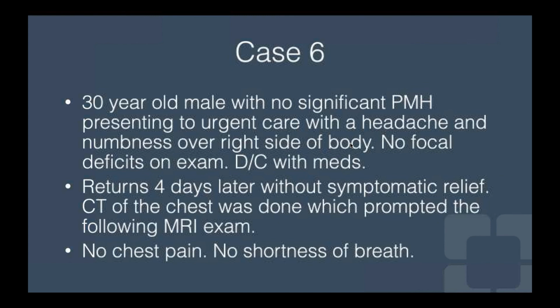All right, so it's a VRT. And you can see the left pulmonary artery kind of crosses above and over the right pulmonary artery, almost like it saddles over it to some degree. Sorry, I think it's spinning a bit fast on my side. I don't know how it's doing on yours, but I think it's quite noticeable.